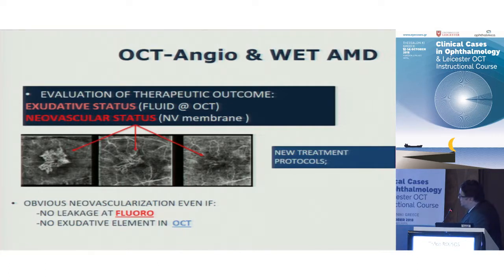Now, where does that actually help us? Let's go to wet AMD, because the OCTA is our main tool for monitoring and treating these patients. It's not that helpful in diabetes or vein occlusion, but in wet AMD it is a very, very interesting examination.